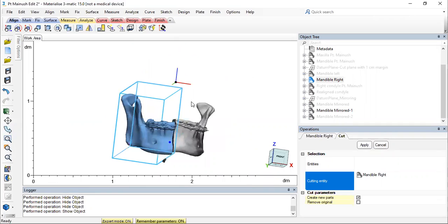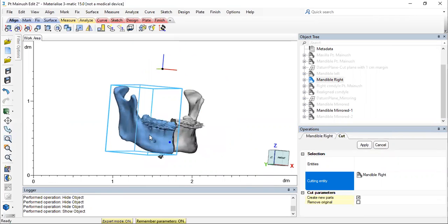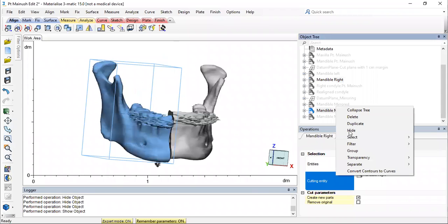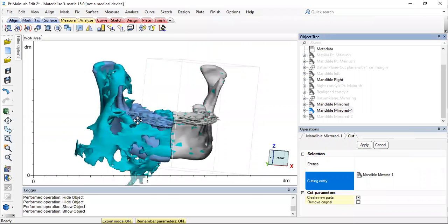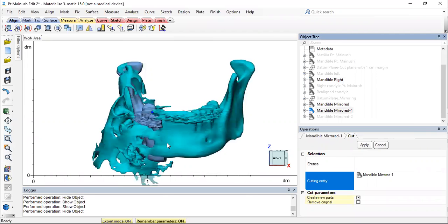Because at the recreation side you will look into whatever nuances, plus or minus, as a process. But the actual anatomy that you retain should match. So our main target remains this, that the mirrored mandible, we want to match this anatomy.